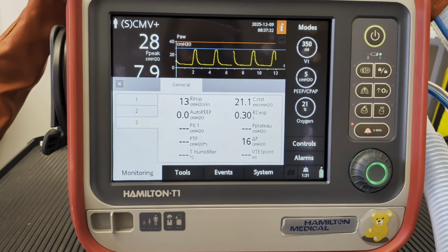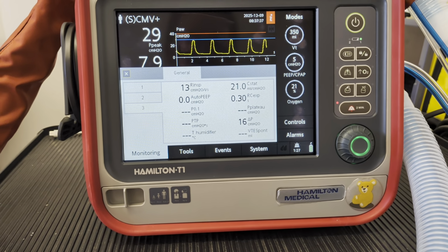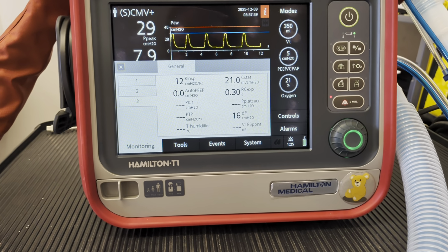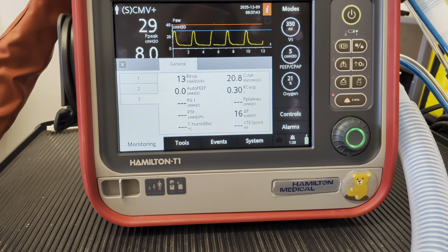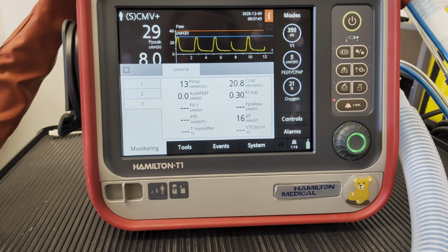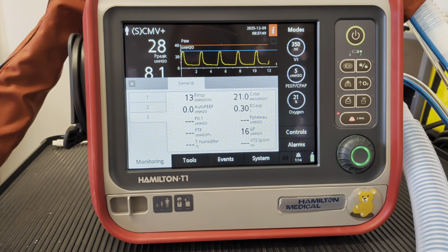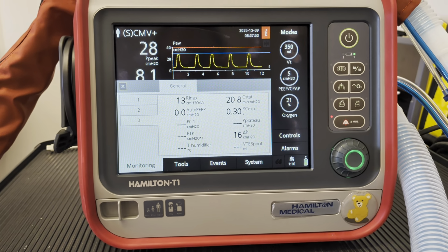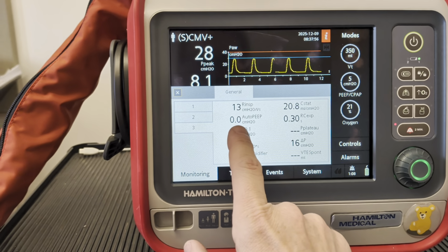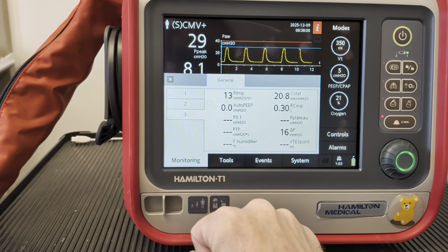But remember, this ventilator is pressure controlled, so there is going to be a pressure control regardless of the mode you select. And so you're really not going to see that. It's going to tell you that it's hitting its peak pressure, but you're not going to have pressures that exceed the limitations that you set. But you can certainly see a marked increase in the airway resistance.